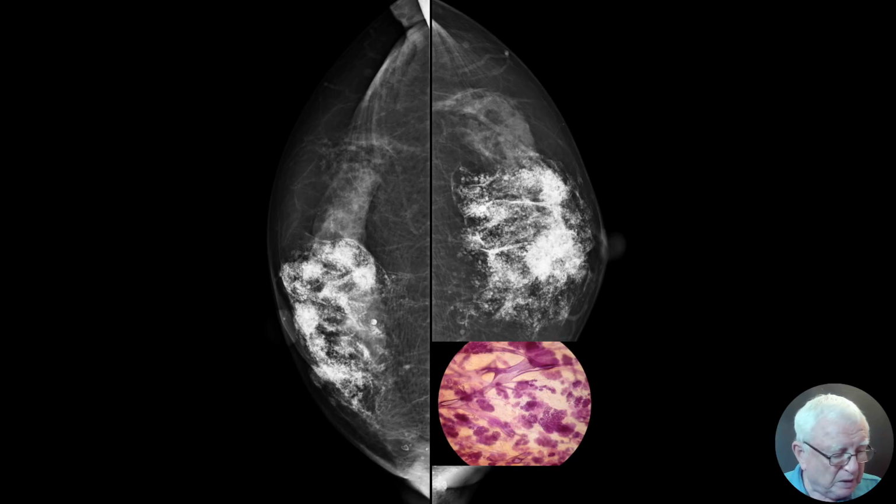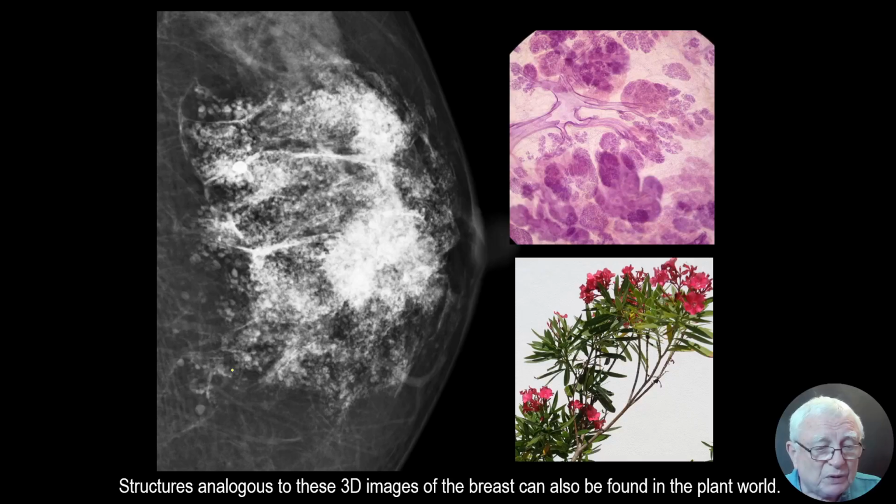But there are some foolish people, and unfortunately they are increasing in number, who go to the witch doctor and ask for percutaneous silicone injection. They are going to feel sorry for the rest of their life because the silicone is going to find its way out. So they are going to have serious nipple discharge for the rest of their life. But for teaching purposes, this is great because I can show you one TDLU, another one, another one, another one, 300, 400, 1000. You see them here.